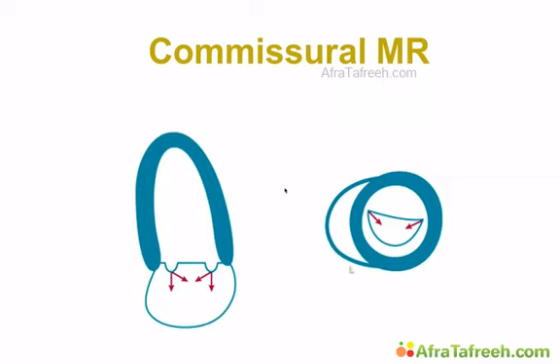You can also display this in a short axis view. Now, this patient did not have such a nice short axis view, but if you use this view and you use color, you cannot really quantify the degree of mitral regurgitation, but you can see where the origin is. The jet would come either from this region, this would be the anterolateral region, or from this region if it's from the posterior medial commissure. So use these two views and they will help you.